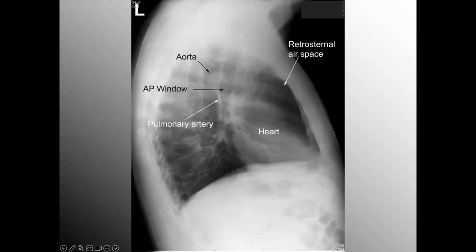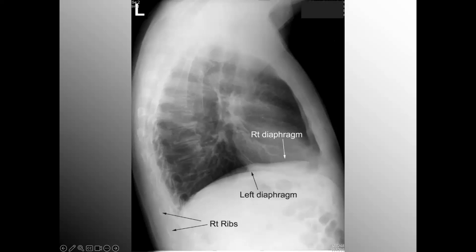Here, once again, the aorticopulmonic window is labeled, as well as that retrosternal airspace, which incidentally becomes quite prominent and enlarged and hyperlucent in patients with air trapping or hyperinflation. Air trapping doesn't guarantee the presence of hyperinflation, although with hyperinflation, there is always air trapping present, right? I know, makes you think.